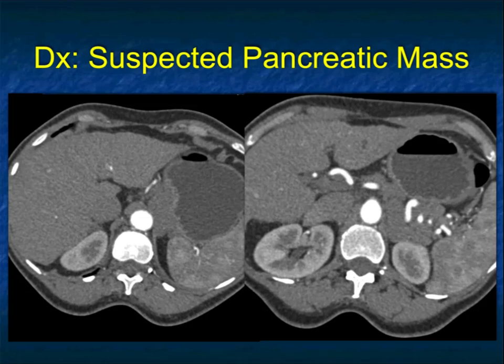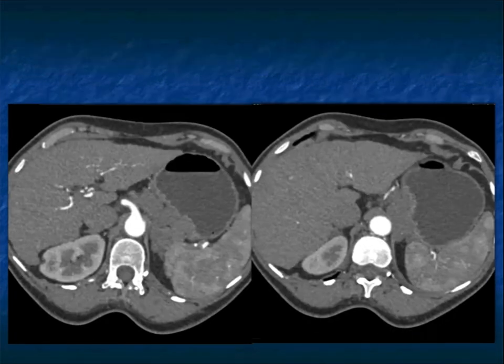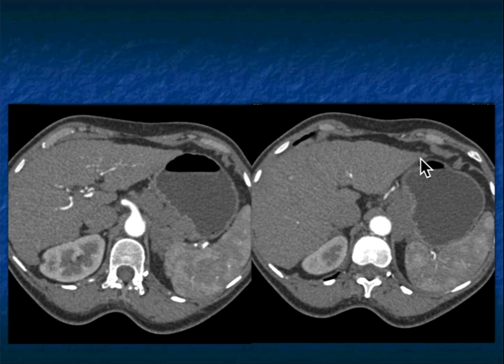The other thing, again, might be timing. This patient was referred in for a pancreatic mass, tail of pancreas. And you see something going on, and the question was they felt it was unresectable. They came to Hopkins for a second opinion. If you look at the left lobe of the liver, the slight nodularity, the patient has cirrhosis. I always make the point that when you have arterial phase imaging only in a cirrhotic patient, you need to be very careful.